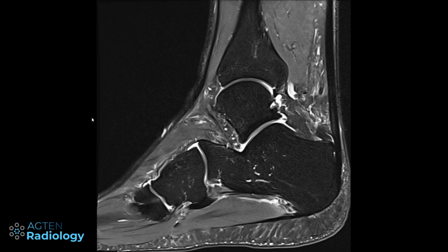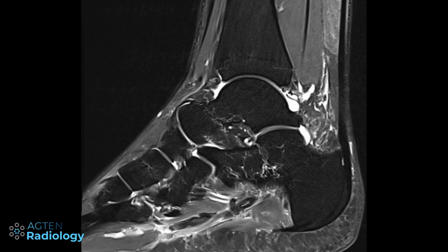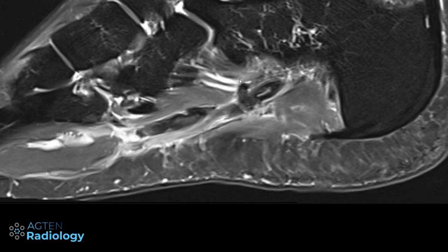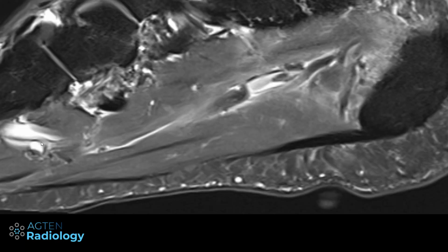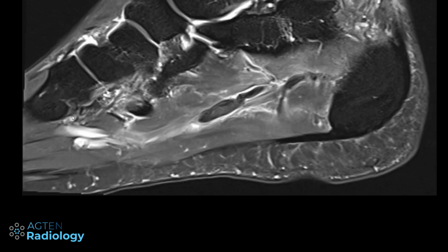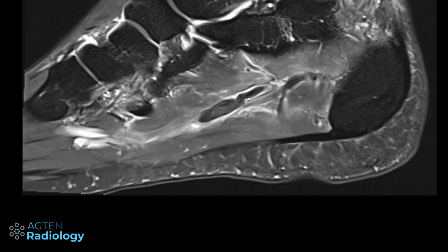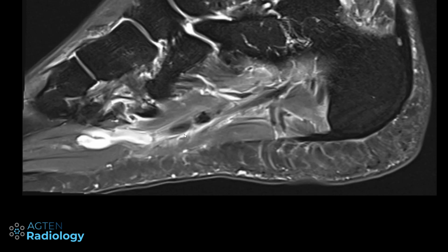a very good eye to depict plantar vein thrombosis. So here in this particular case, when you look carefully, let me just make this a bit bigger. There is the plantar vein here, the veins. We will focus on the terms here just in a second. And then there is some low signal stuff here, which looks atypical. This is not the typical phlebolith that you would see.